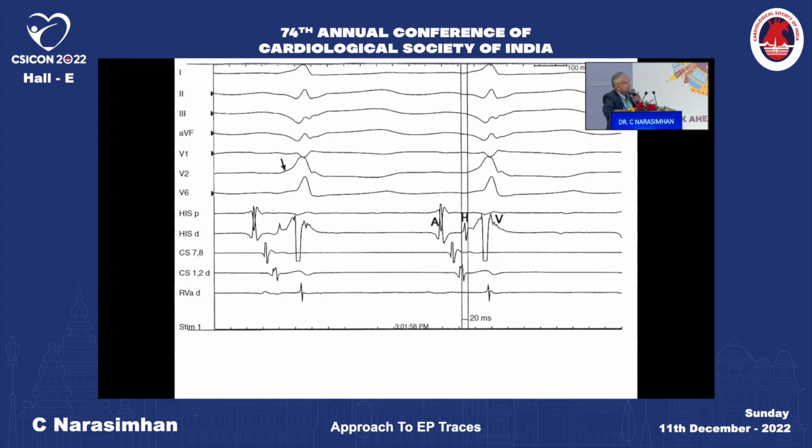So, for example, the same atrial His and V that you saw, A His, but the V has started very early. Even before it reached the ventricle, in this area in V2, the delta has started. Can you see this? So that means there is an accessory pathway. Physiologically, you expect after the His bundle an isoelectric interval, because His is insulated, you don't record any electrogram.